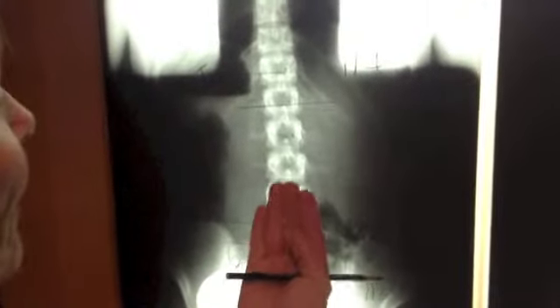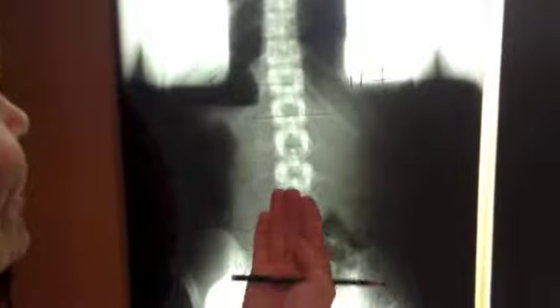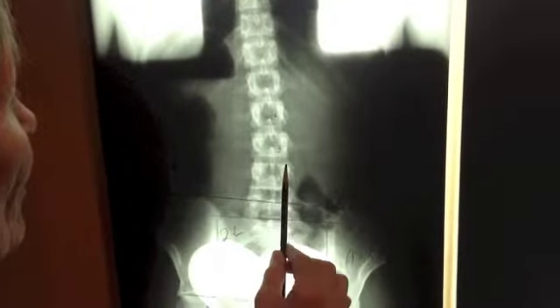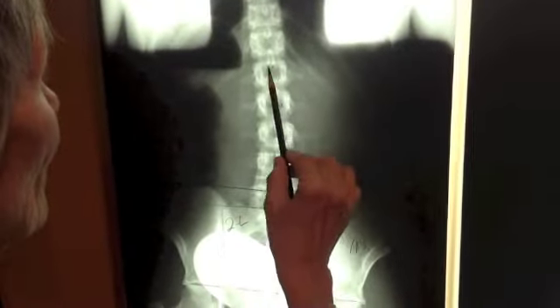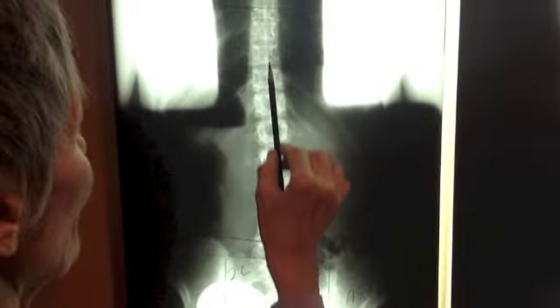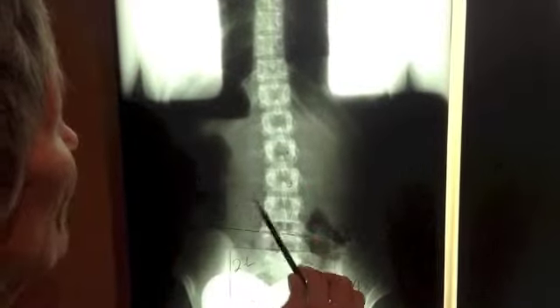Now let's go up until we see the spine. So it's going to go off, off, off, off, and then where does it start to correct itself again? That's where you call it a level base, and then the next one that goes off. You can see that this patient has a curve going this way, and in the thoracics, she starts to even out. So we'll get into this more when we get into the thoracics. But basically, you don't mark the film again until they reach a level. Although, we could say that this one reaches a level.